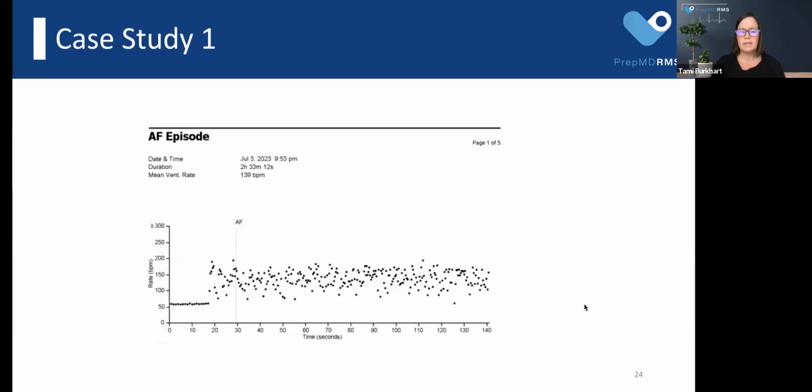So we alerted the clinic to this because the patient was not on an OAC, and they immediately started them on an OAC for this. So initially, this is not what they were looking for. The patient had a history with a Holter monitor where they had picked up some NSVT episodes, and they figured that that might be the reason that he was passing out. But then they found this. So it's always good to keep your eyes open to everything that comes across with these transmissions.